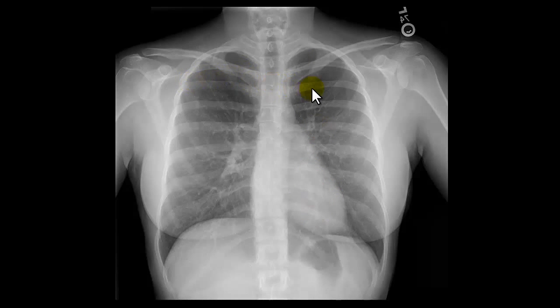And then we can take a quick look at both lung fields at the same time, make sure everything is symmetric and nothing is popping out. And basically that would complete the search pattern of a normal chest x-ray. You want to make sure you also look at a lateral if it's available, and make sure you check with a prior if that is available.